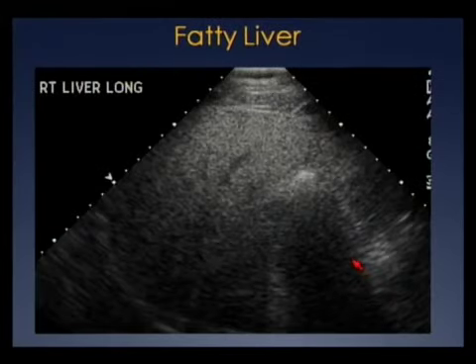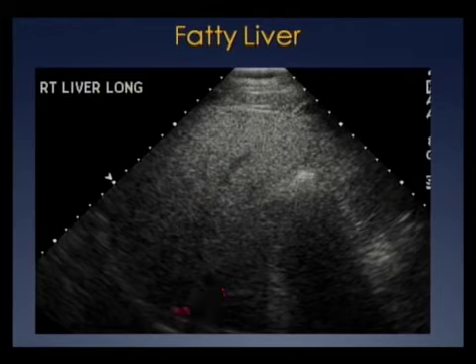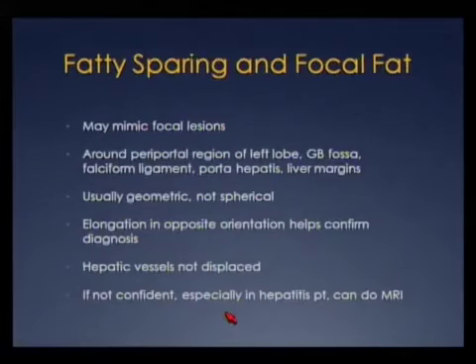So here's a case of severe fatty liver where we have an echogenic liver, but as we progress more posteriorly, we lose the sound beam. It basically attenuates. We lose any vascular definition we may have had more proximally, and we really don't see the diaphragm very well. I don't know if the diaphragm is this down here or this up here.